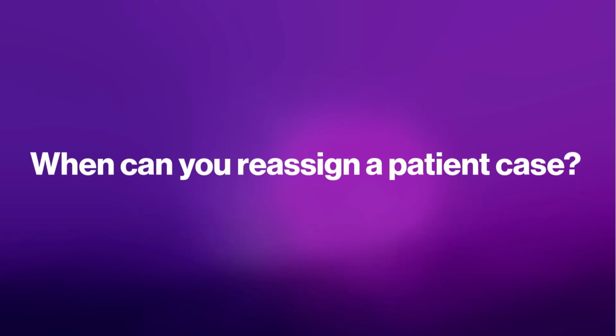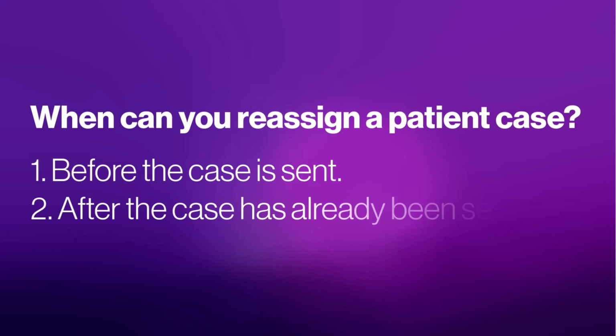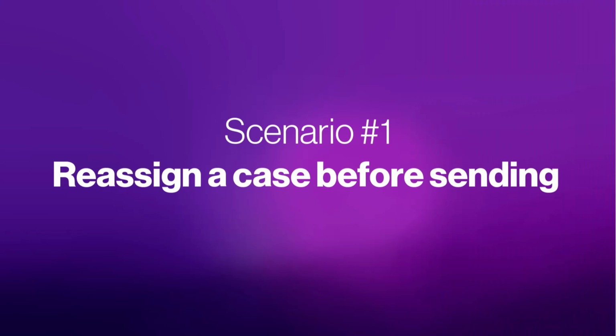There are two scenarios for reassigning a case: before the case is sent and after it has already been sent. Let's start with how to use the Reassign feature before sending a case.